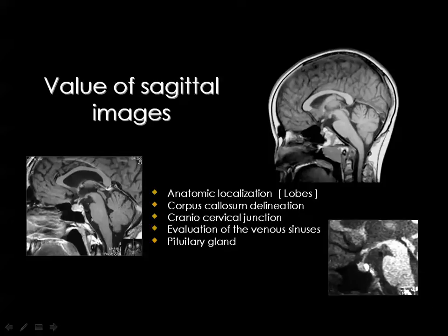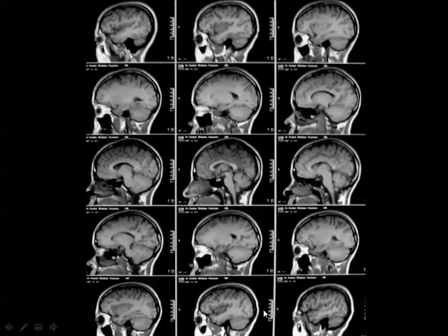Then if you inject contrast, both parts will enhance similarly. Then you cannot discriminate the posterior from the anterior. Then you know that MR images start from the sagittal images, start from the left and ending on the right side. Then this is the left image and this is the right image.